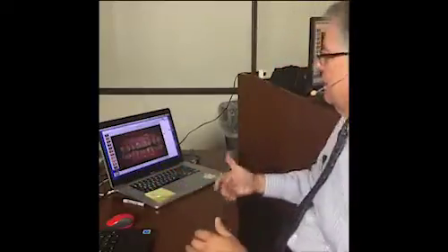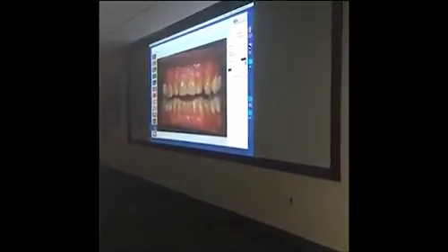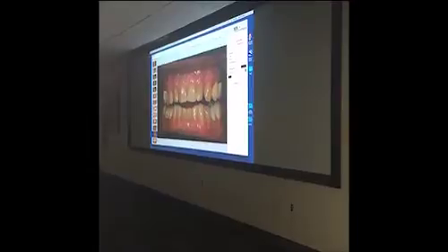Now, if I want to put in where I think I'd like teeth to be, let me tell you that if I look at gingival margins for Craig, it looks pretty good. He wants his teeth to be longer, his front teeth. And if we look at the buccal cusps of his premolars, we can see that the incisal edges are apical to that, aren't they? Okay, and one of the rules is, you know where the least length you want on maxillary central incisors? Buccal cusp tips of the maxillary premolars. If they're shorter than that, it looks like a reverse or a flat smile to us, and we notice it.